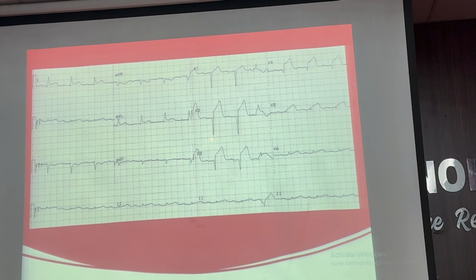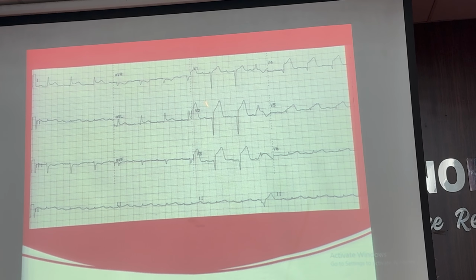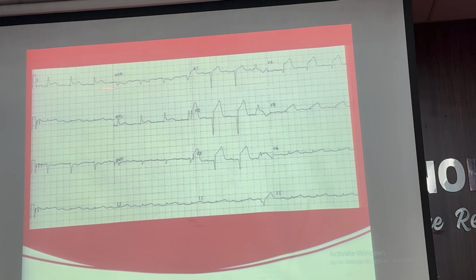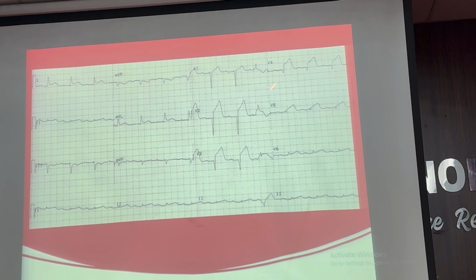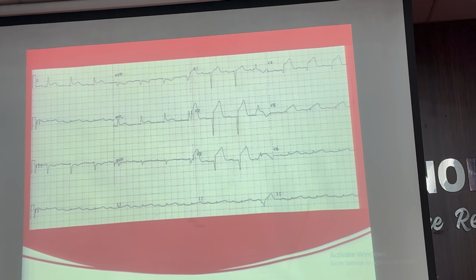So again, another anterior STEMI. This is called a tombstone ST elevation, just for more terminology, but anyway, the management is the same. So tombstone ST elevations in the anterolateral leads and the reciprocal changes. If you carefully look in the aVF and III, there are some on top of it. There are some occasional LV epicardial origin ventricular ectopics.